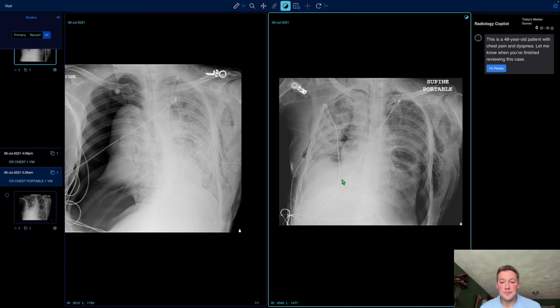That's great. And what else is happening on this radiograph that's life-threatening for this patient? Yeah, it's staring me right in the face there. A large pneumothorax that's beginning to form. So we have the separation of the parietal and visceral pleura of the lung, and the pneumothorax is back.